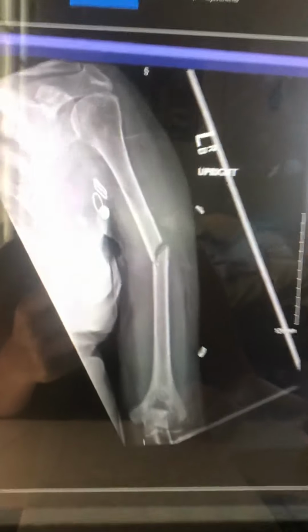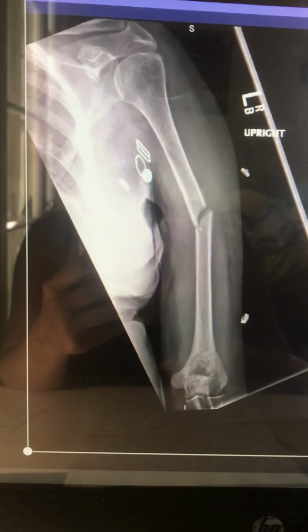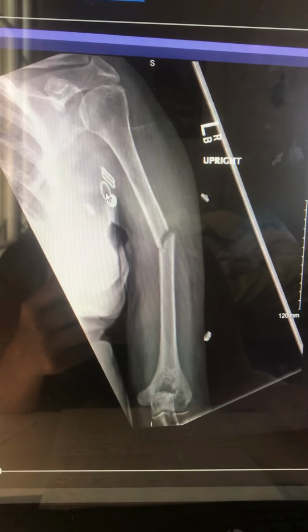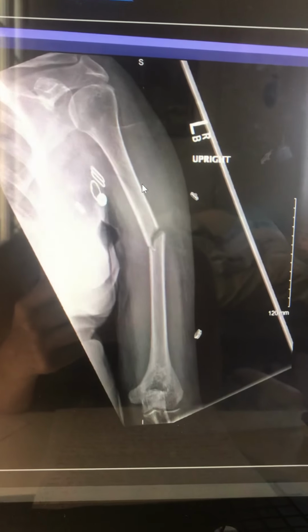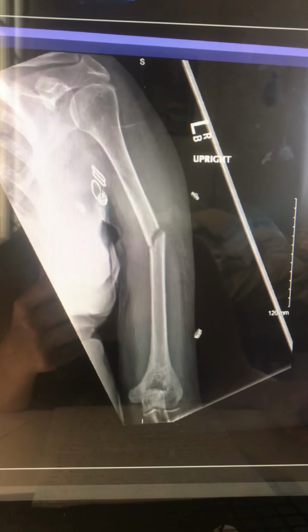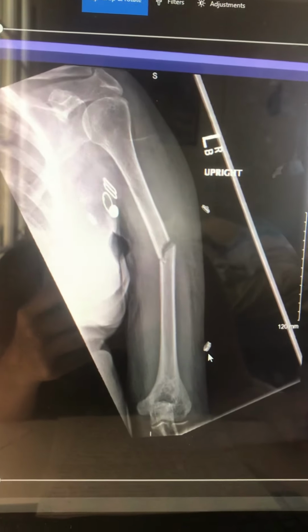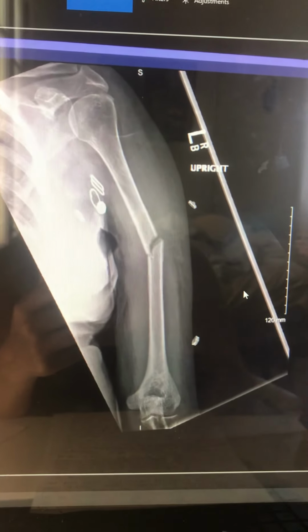So this first image is the AP humerus. It shows good bony detail to include trabecular markings here. Soft tissue of the skin is seen. There are artifacts. This is the patient's bra. She couldn't take it off; she was in extreme pain. These little snaps right here, one right here, that's the gown. They have metal snaps.